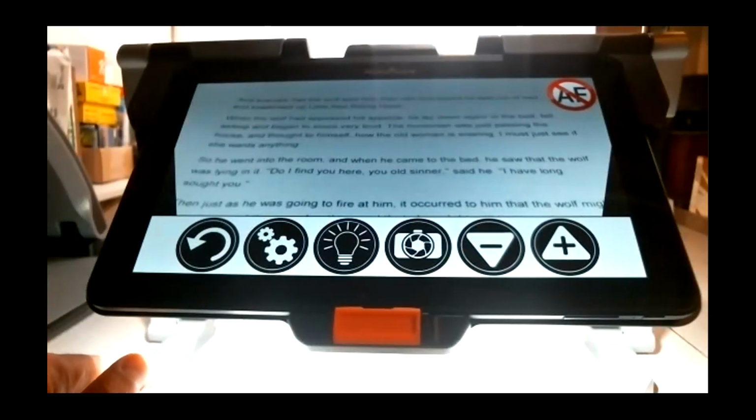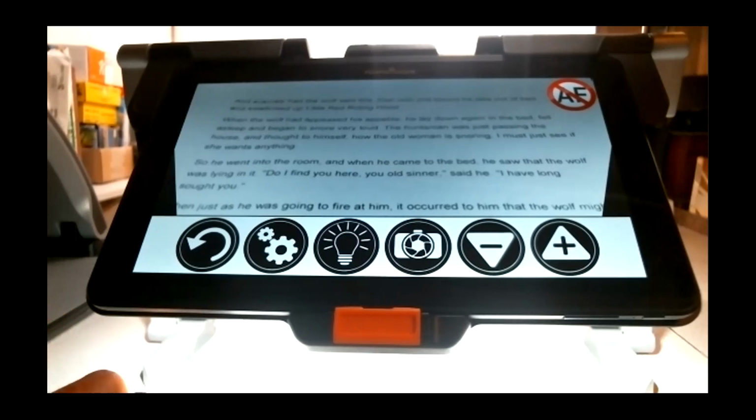I will just put my list. I've made a special list to go through all the gestures so that I don't forget any.